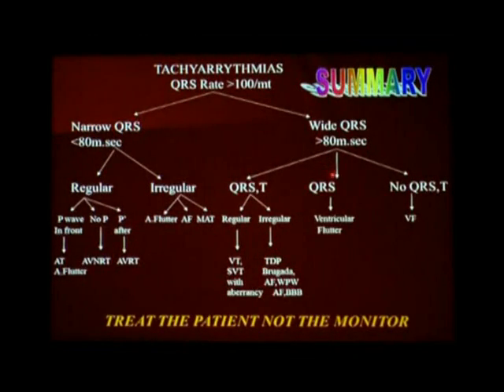If we make out only the QRS without a T wave, it is ventricular flutter. If you don't make out the QRS and T wave, it is ventricular fibrillation. The treatment of choice is cardiocerebral resuscitation first, followed by shock as soon as possible.